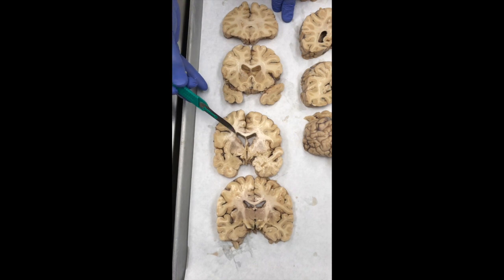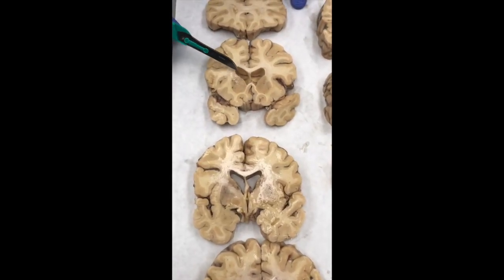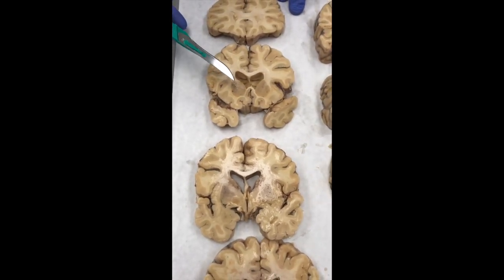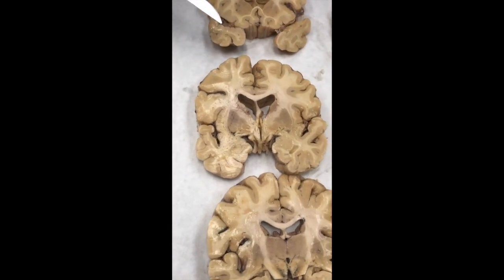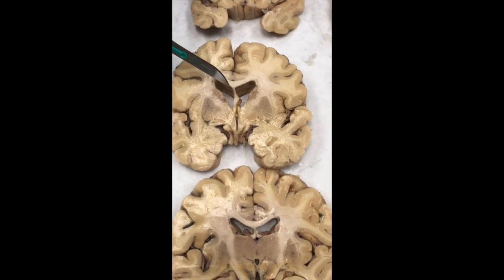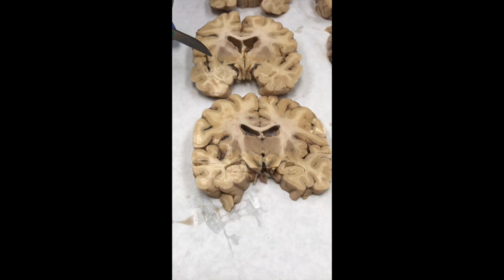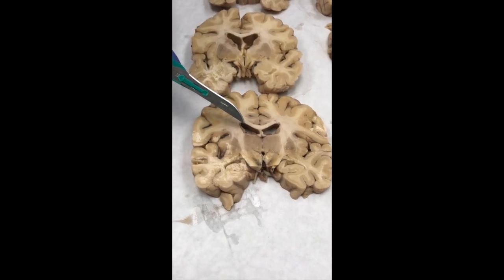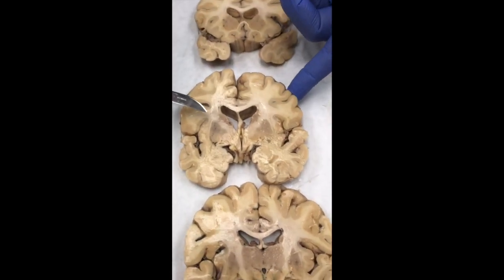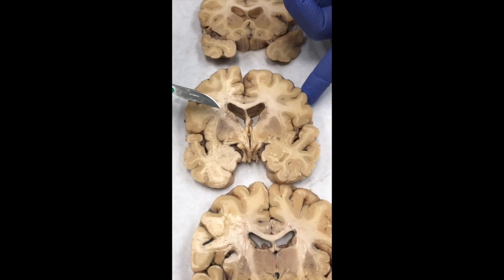Bulging into the ventricle, we can see the caudate here, or in this portion more anteriorly, the bulging of the head of the caudate and the underlying putamen there. Both those structures look intact. There's a small vessel there in this one, but I don't see any evidence of infarction in those tissues. If you follow the caudate back, it becomes smaller and smaller as you get further into the posterior portions of the brain. Up here, approximately a little bit behind the temporal lobe tips, one can identify the basal ganglia.